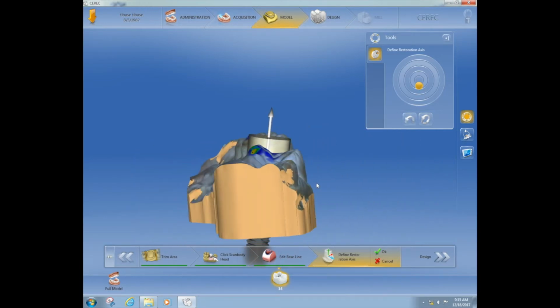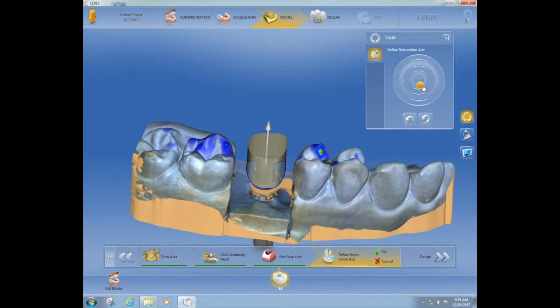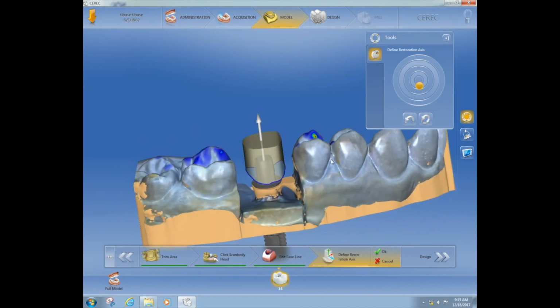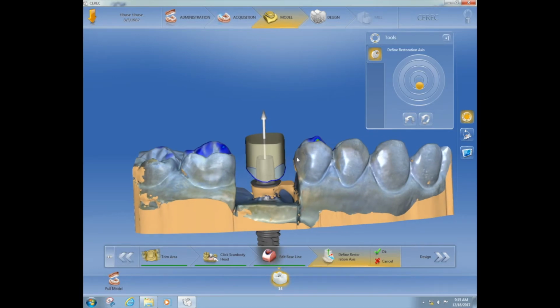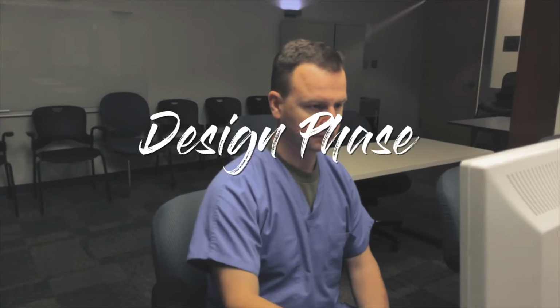You may have to change your rotation just to see that. I did it for you to show you that you can align those. Those do not necessarily have to be aligned. It's just that the dotted line shows you the path of the implant, and then you're lining up your crown with your adjacent contacts. So luckily somebody at least placed that straight up and down, not buccal.